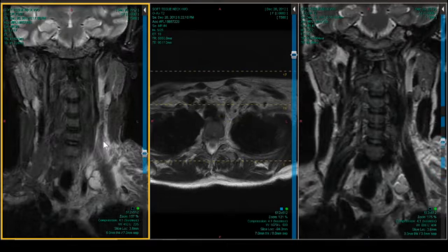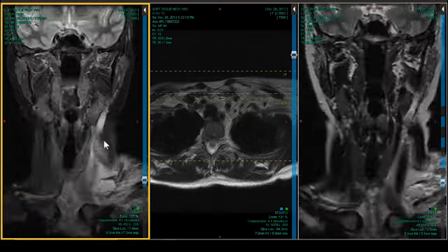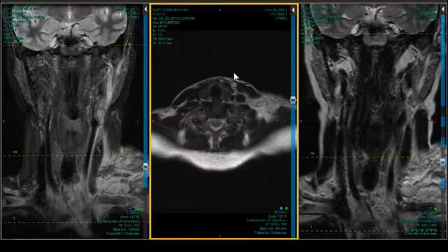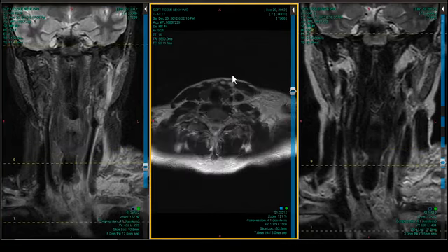And there's a lot of swelling in that left neck. She was not kidding. Look at the disparity. That's all you really have to find if you're a resident on call, because now you pick up the phone and call your attending. Say, something bad is going on here. I don't know what it is, but I need you to look at this case right away. And you're good, right? Can't miss that. So don't rely on your T2.